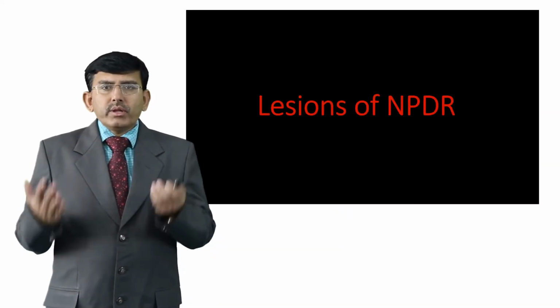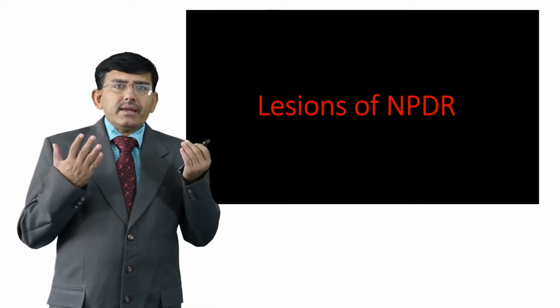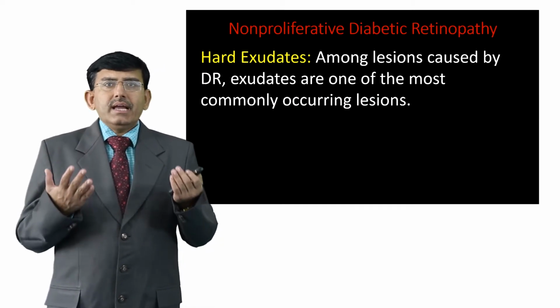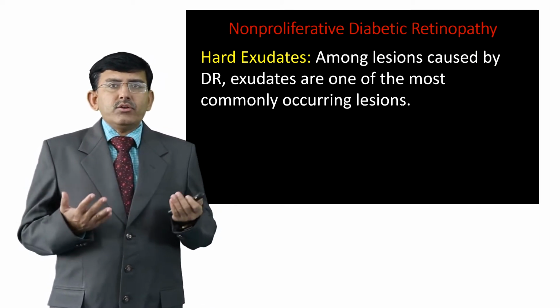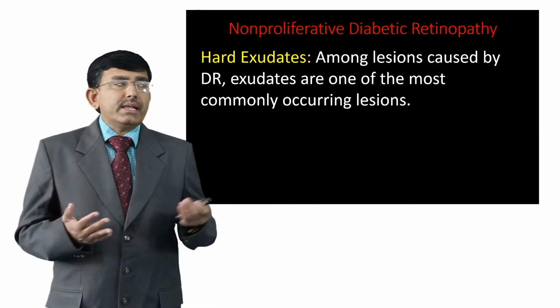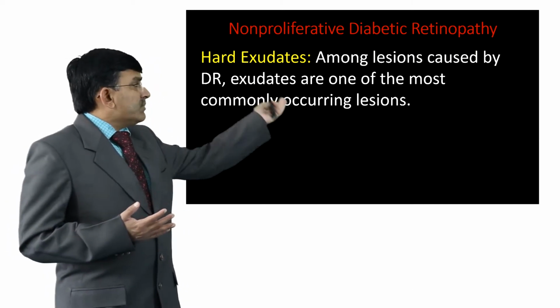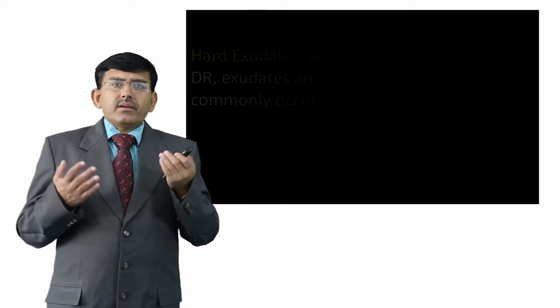Biomedical image processing course. In this module, we will cover different techniques to detect lesions of non-proliferative diabetic retinopathy. Number 1, hard exudates. Among lesions caused by diabetic retinopathy, exudates are one of the most commonly occurring symptoms in diabetic patients.